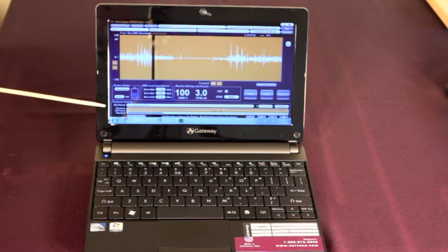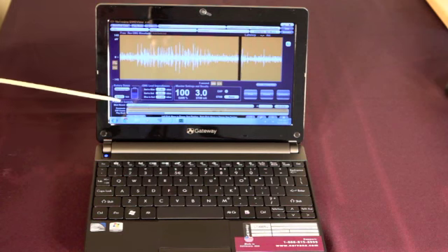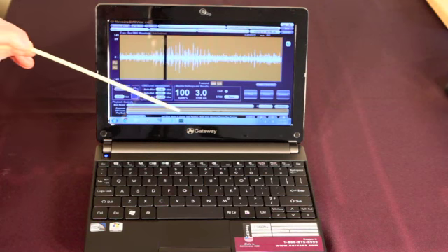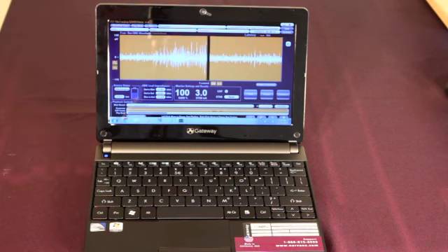Next, I'm going to move to the very top bar. And there where it says Most Recent, you'll see some text appearing in the white bar. That text indicates whether the test button on the Nirvana was depressed or if a comment had been entered during the recording.